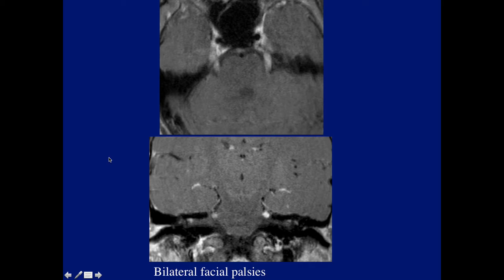Okay, here's a patient who presents with bilateral facial palsies. What are the findings here?